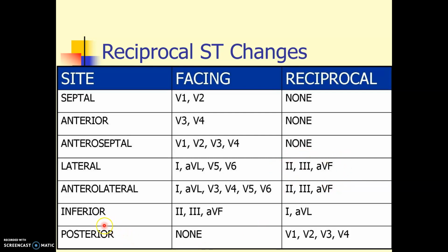It's again just going back to the thing about STEMI equivalence. If you look at a posterior MI, there are no leads that show ST elevation changes because there are no leads pointing to the posterior aspect of the heart. All your clues come from reciprocal changes.